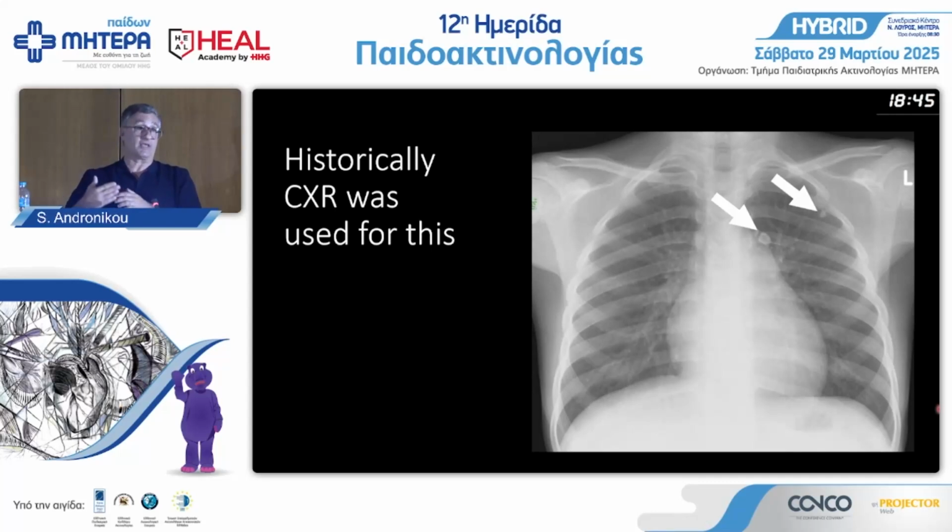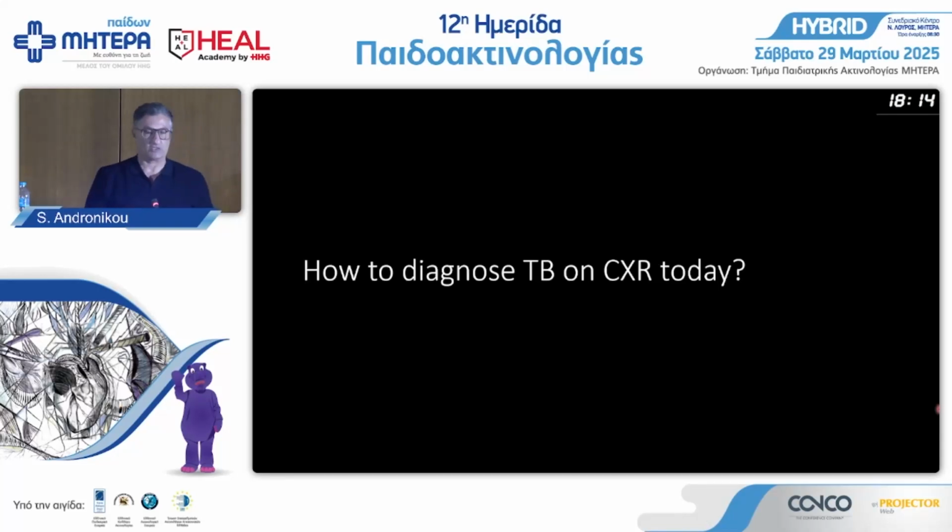Maybe you would see more with a CAT scan. But we hardly ever see calcification. I've been reading now, last year, I haven't called one calcification in 4 TB trials. Okay. So it's very rare. If you see it, no problem. It's very easy to see, you can call. The problem with this, they used to look for calcification to say, you don't have active TB. It's calcified. You have dormant TB. Okay? And we don't use those words anymore, but that's what they used it for. Anyway, look for it, but it makes no difference. You're not going to see it. So let's not waste our time.